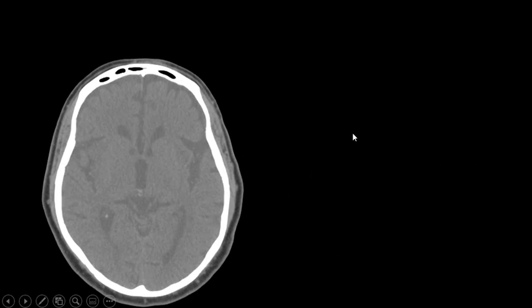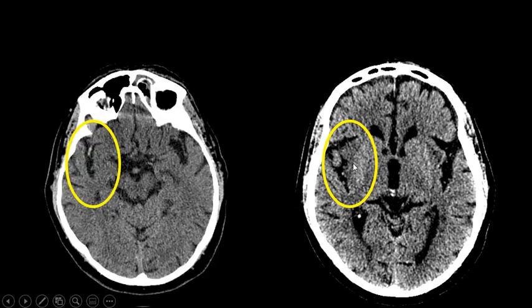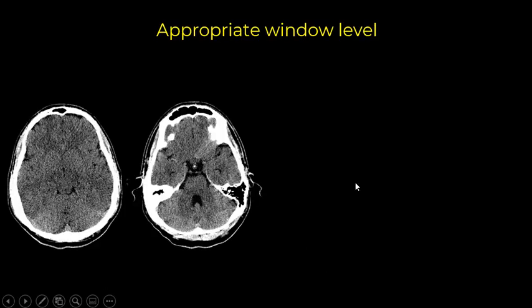And this is the exact opposite case, in which we see the soft tissues very well, however, we cannot see the brain parenchyma or the parenchymal pathology and anatomy very well. When we changed the window for that case, we realized that we lost this gray-white matter differentiation that we were discussing earlier at the level of the insula and subinsular region, and this is a case of acute infarct in the middle cerebral artery distribution that we missed on that other window.